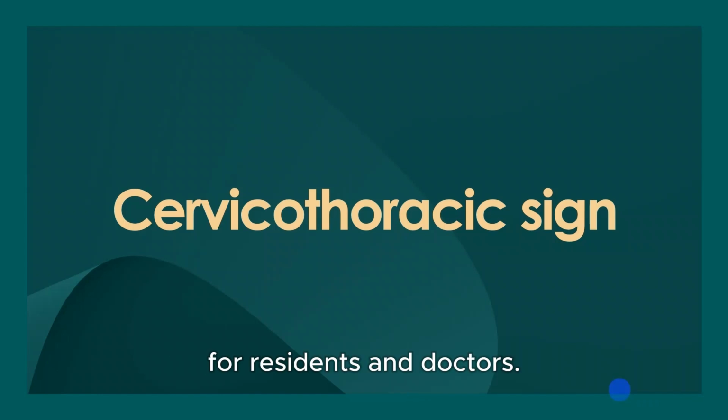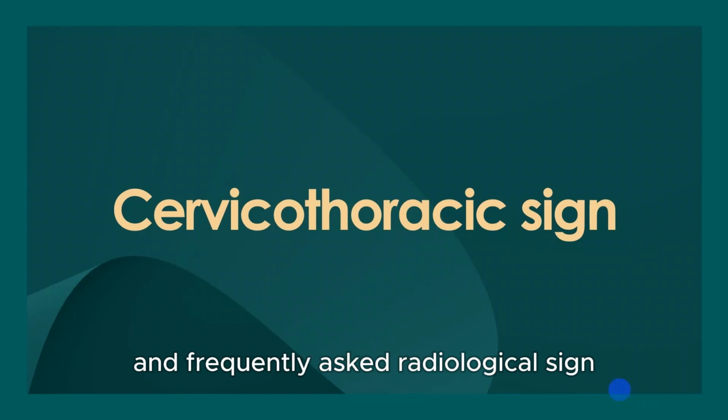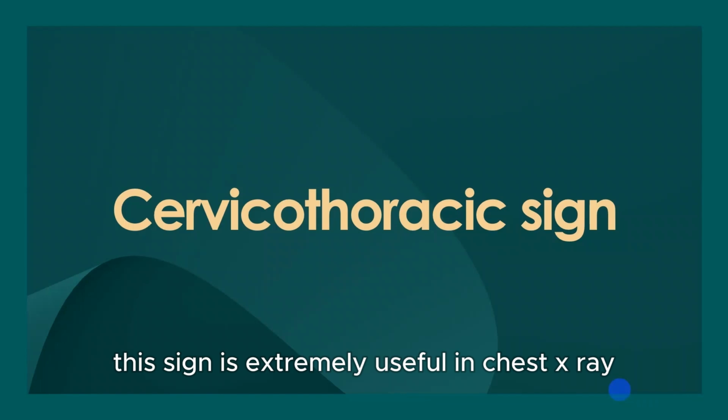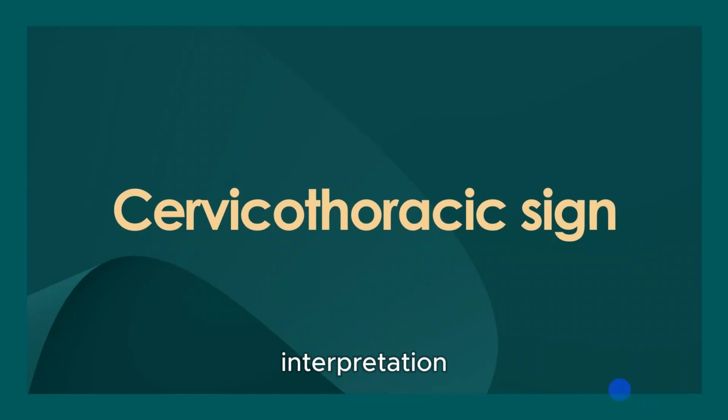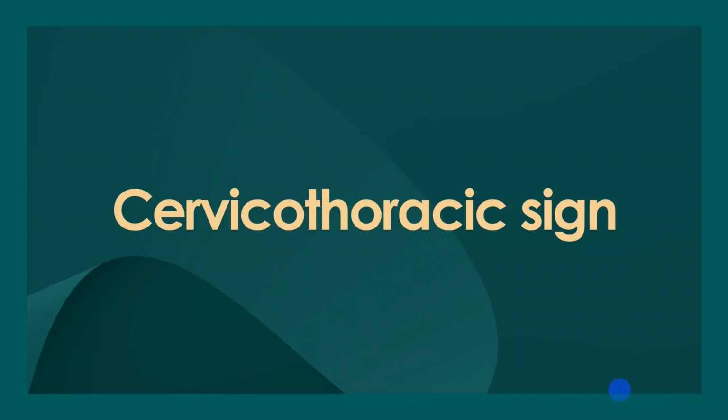for residents and doctors. In today's video, we are discussing one of the most important and frequently asked radiological signs in chest imaging, the cervicothoracic sign. This sign is extremely useful in chest X-ray interpretation, especially for localization of mediastinal masses on plain radiographs.